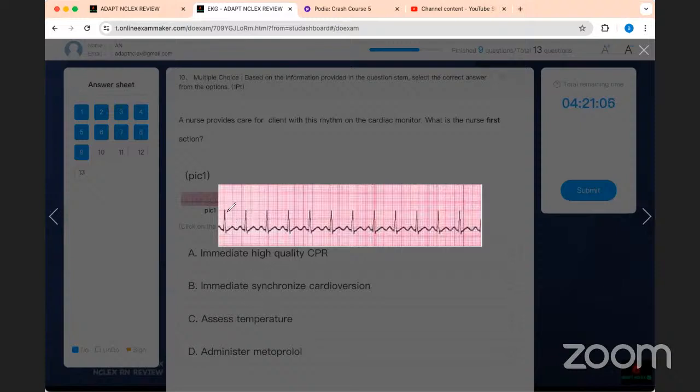Once again, check if it's sinus or the rhythm is regular. You see, there's only 2.5 boxes. This is the same. This is the same. Therefore, I know it's not AFib. I know this is some rhythm that is regular. I try to calculate the rate. It's almost like 100, like 110. 2.5, so over 300, probably like 110 or something like that. So the heart rate is 110.